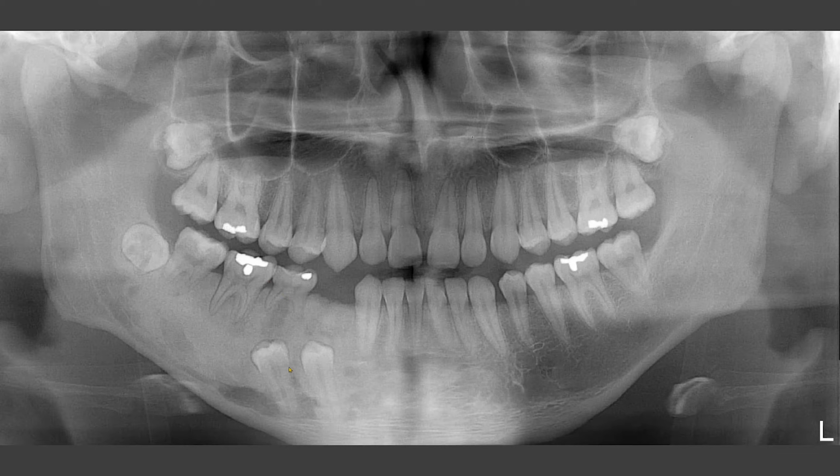The premolars are impacted and distally tipped. These two teeth are inferiorly displaced. The trabecular pattern in this area is grainy. A good trabecular pattern is seen on the mandibular left premolar and molar region. These are almost horizontal, thin radiolucent lines. If you take a fine pencil, you should be able to draw these lines. On the right side, you are not able to draw these trabecular patterns. These are grainy. Some textbooks will describe this as ground glass appearance.